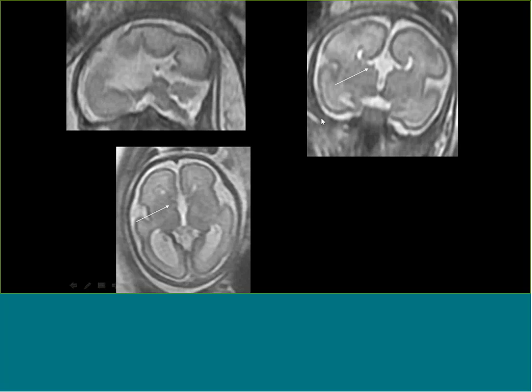So this is what agenesis looks like, and you can see that this patient had mild asymmetric ventriculomegaly. I think all of you can recognize that in the absence of the corpus callosum, the interhemispheric fissure will extend and communicate directly through a third ventricle on a coronal image or an axial image, because the genu should always be here. And if you have a good sagittal image, then you can demonstrate the absence of a structure, which is not always an easy concept to grasp, but clearly there's no corpus callosum there.